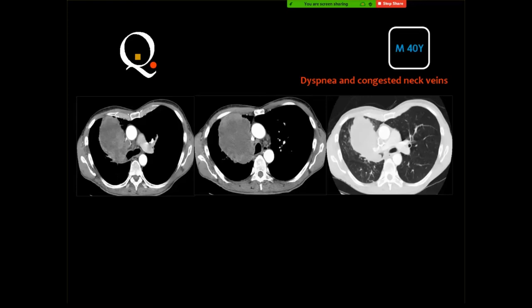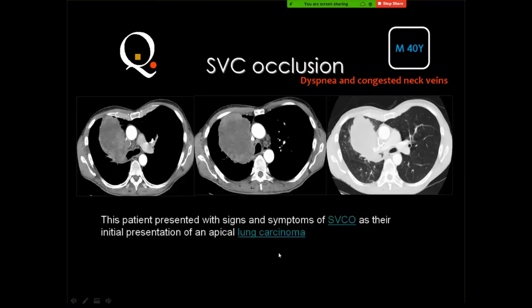Bronchogenic mass with superior vena cava thrombosis. Yes. Right bronchial invasion? No, this is not true, but there is some encroachment on the right main bronchus, and there are some lymph nodes here. This mass in the lung of an adult should be considered a bronchogenic carcinoma until proved otherwise. The superior vena cava is filled by tumor thrombus, and there are some lymph nodes in the aortic window.